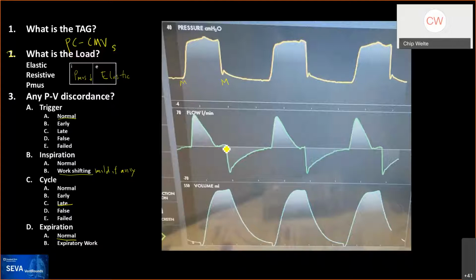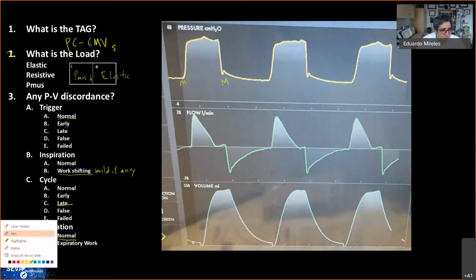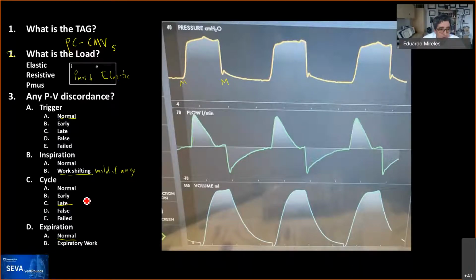But that's really it. Yeah, so I also have trouble looking at this. Obviously what Chip is talking about, this is the worst color I could have chosen for this graph. Let's try red.